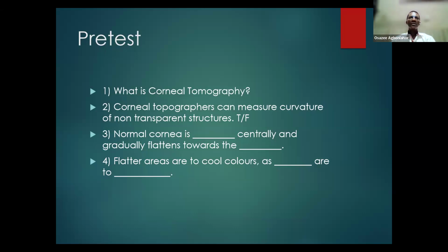And not necessarily giving you in 3D form. You can still put it in 2D because most times, just like I showed you during the presentation, you see how it gives you the front surface and the back surface. So it mustn't necessarily give you a 3D form, just as even your OCT tomogram is not in 3D. You and I know that it's still 2D, still flat.